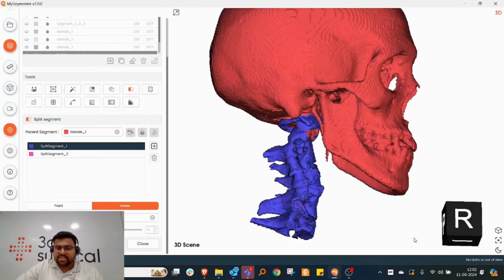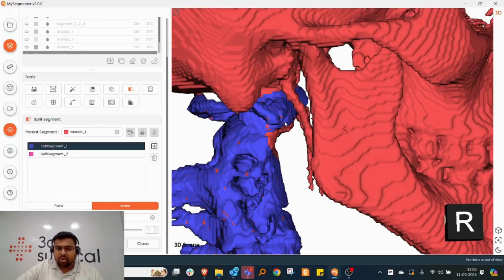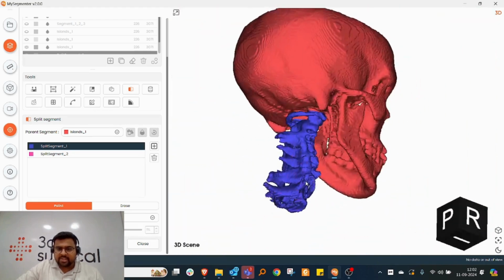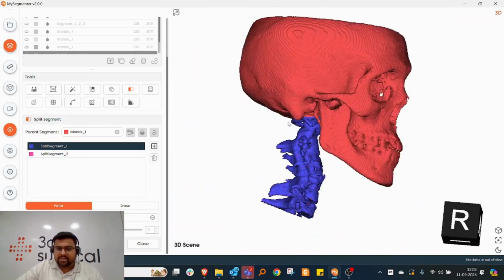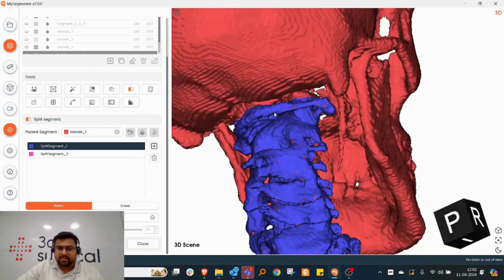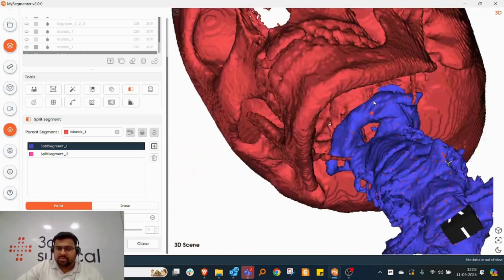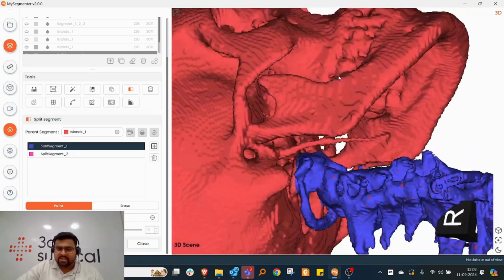And also you can see that some of the areas are not included, so again I can modify my selection here a little and it will be added. So let's say now I'm fine with my spine related separation. Okay, and I will see it from all the perspective views to check that I'm not missing anything.